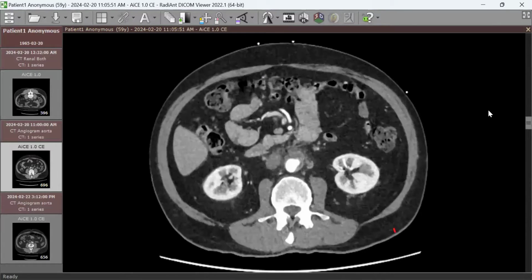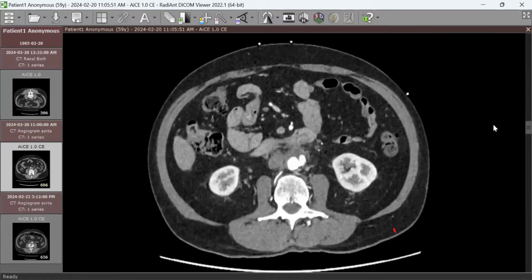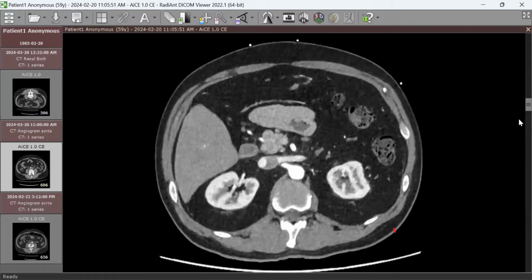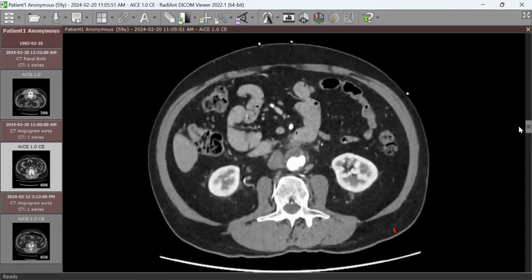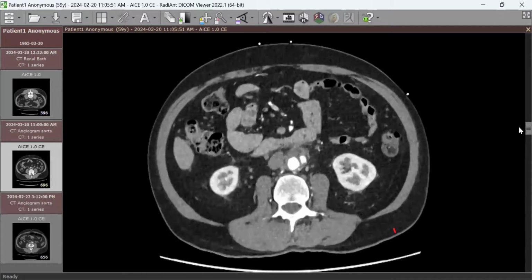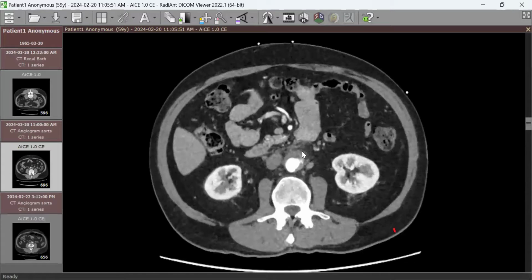Here in this section, this is approximately the level of the renal artery. Yeah, it's below the level of the renal arteries. What additional findings? We have saccular dilatation of the abdominal aorta, possibly an aneurysm, surrounded by periaortic stranding. Not only stranding, possibly mycotic. Yes.